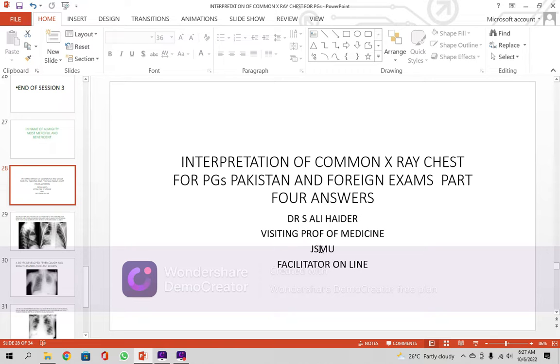I'm Professor Sayyid Ali Haider. But argument can be there, of course. The simple answers will be presented to you. So the first X-ray which is given by me is this one.